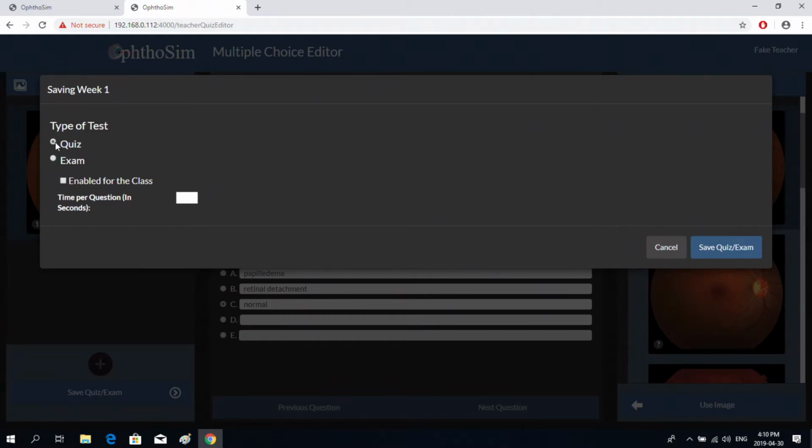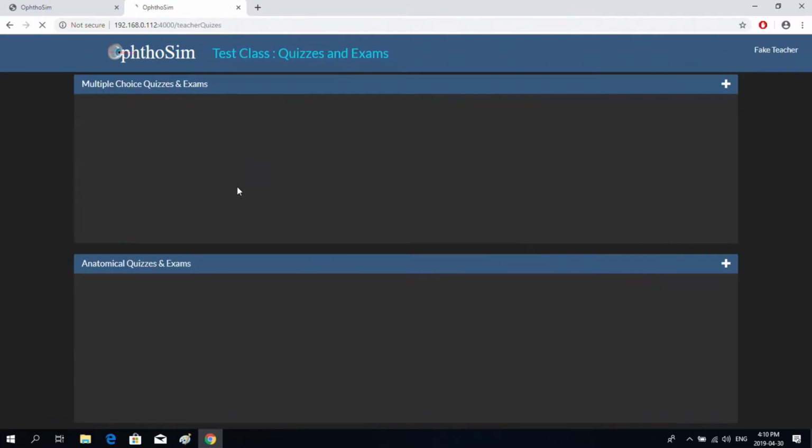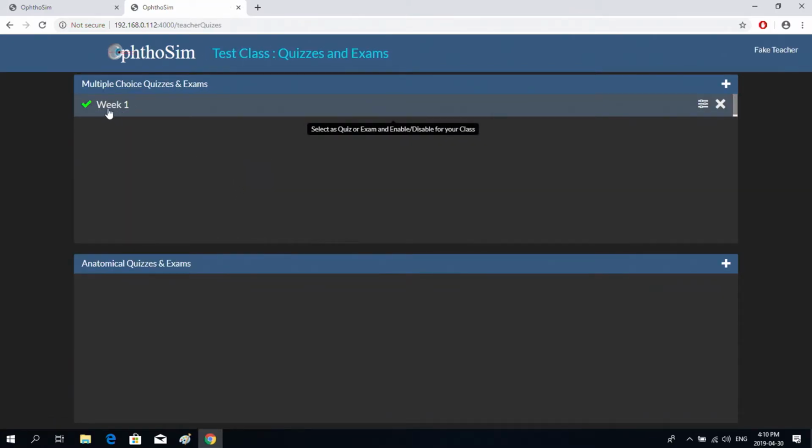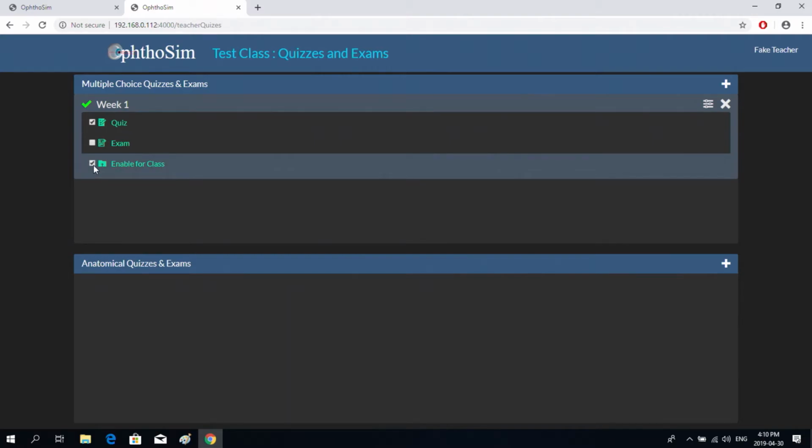So in this case, I'm going to call it a quiz. I'm going to leave it a quiz. I'm going to enable it for the class, and I'm going to give the student 30 seconds to answer that question. And then I'm going to save it. So now that has been activated. If I go back here, I'll see week 1 has been activated. If I click on it, it's a quiz for the class.